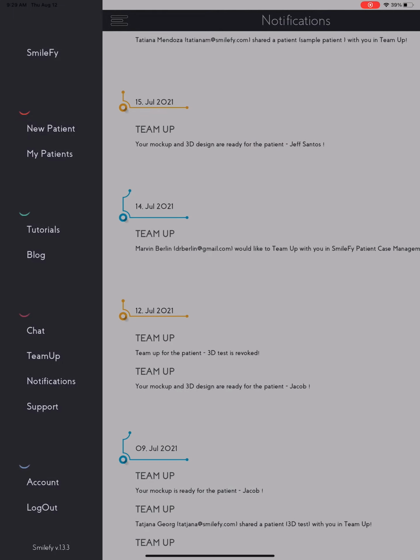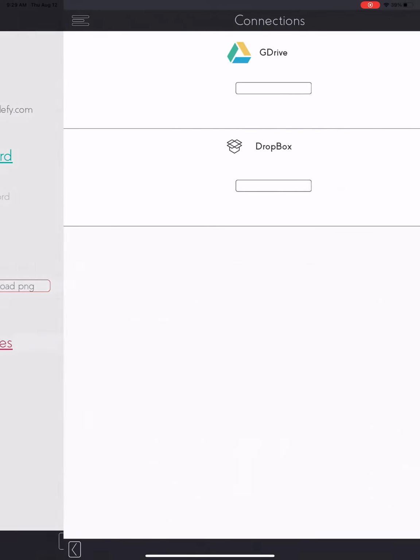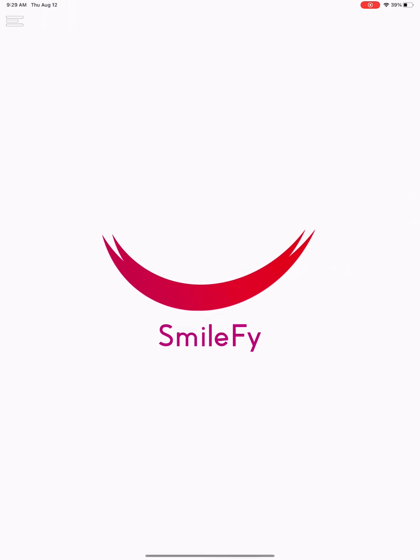In Account, you can manage your account like changing your password, adding your clinic logo, changing the language, or connecting to Google Drive or Dropbox. Select other videos on the tutorial page for more training or solve any questions you have.